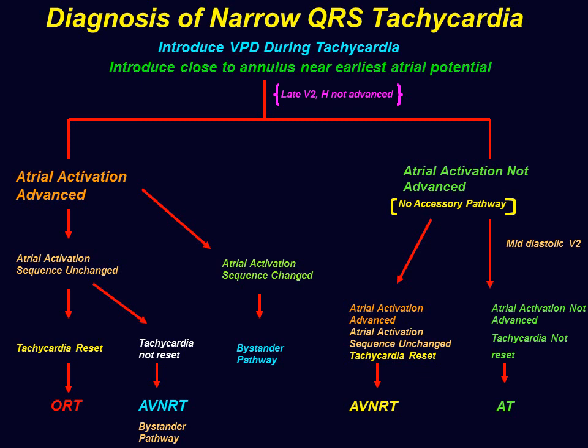That means you have to really ascend up to the fast pathway and re-enter the slow pathway. That means it's AV node re-entry, and typically the prematurity of the PVC needs to be greater than 100 milliseconds, very suggestive of AV node re-entry.